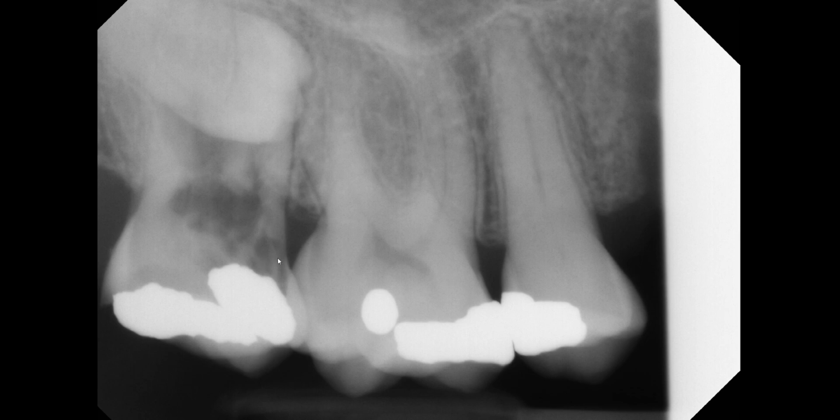It's hard to explain, the fact that this is a separate lesion from this larger radiolucency, how does this come about from the pulpal tissues? Yes, you can have a mesial pulpal horn that would extend out this way, but I would again expect enlargement of the mesial pulpal horn, whereas this appears to be separate from the main radiolucency, and also it extends to the root surface or the tooth surface. So based on the radiographic features, I think I have enough features to suggest that this is external resorption.